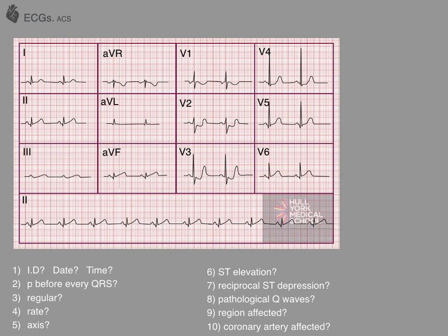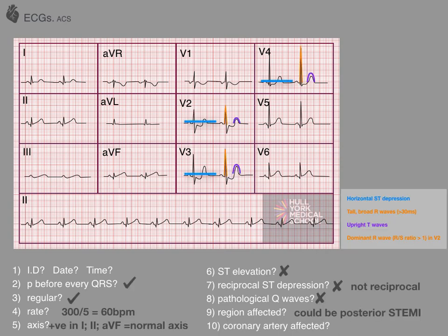Final example in this talk, and this one is perhaps a little more tricky to analyse, and we haven't really talked over these issues, but it's worth being aware of. So if you want to pause the video at this point and have a look at the ECG yourself. So again, instead of freaking out that someone's placed an ECG in front of us, we're going to go through things in a nice calm logical order.